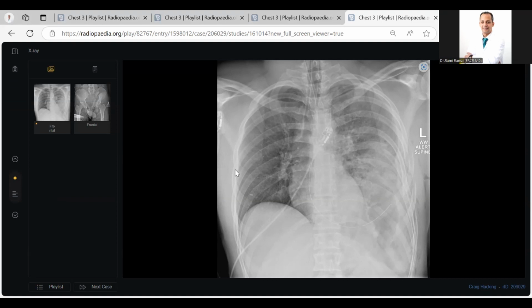However, the cardiac size appears normal. The upper visualized left lung also appears heterogeneously opaque, and there is mild mediastinal shift toward the contralateral side. The right lung and the right hemidiaphragm grossly appear unremarkable. The right hilum also appears unremarkable.